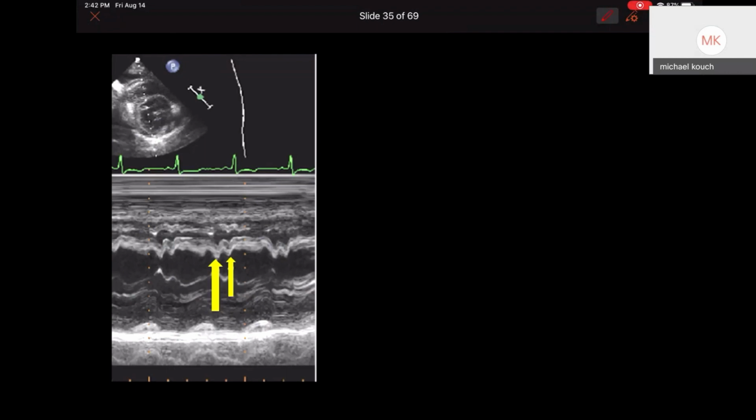So what we see is this is a patient with constrictive pericarditis. Okay. Now we're going to go over a whole separate lecture on pericarditis, so I'm not going to dwell on it too much. But there's a couple findings that you'll see. You'll see respiratory variation in your RV chamber size, but you're also going to see an early diastolic dip, and that's very common in constrictive pericarditis.